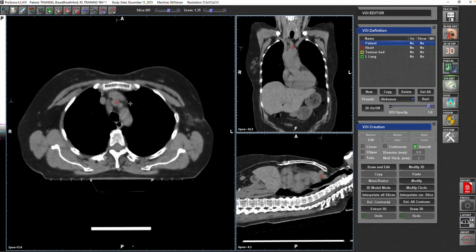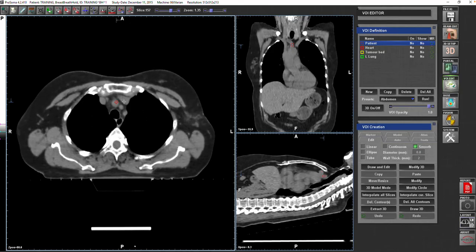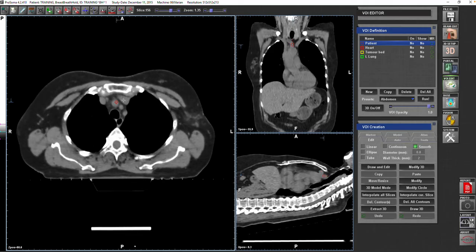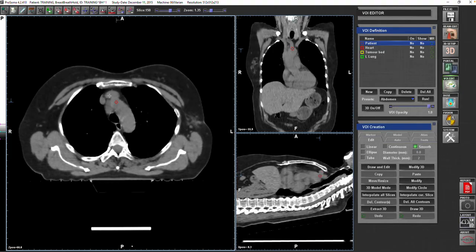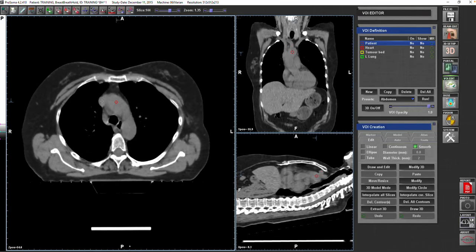The subclavian vein also will do another arch, but the second arch will be inside the mediastinum, because when the subclavian vein joins the internal jugular vein, they create what is called the innominate vein, and the innominate vein on the left side will cross the mediastinum, as you can see as I'm scrolling here, to meet the right innominate to create the superior vena cava.